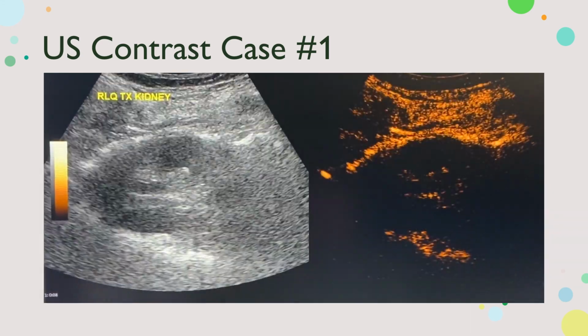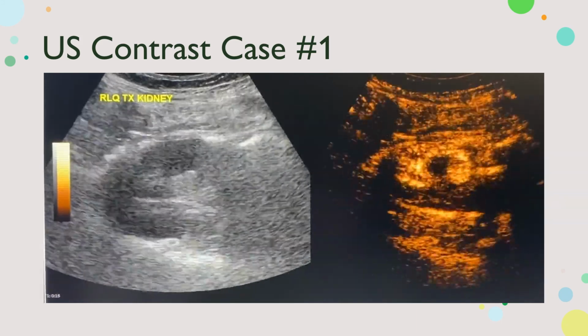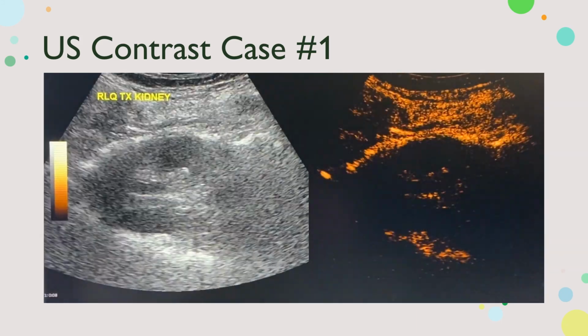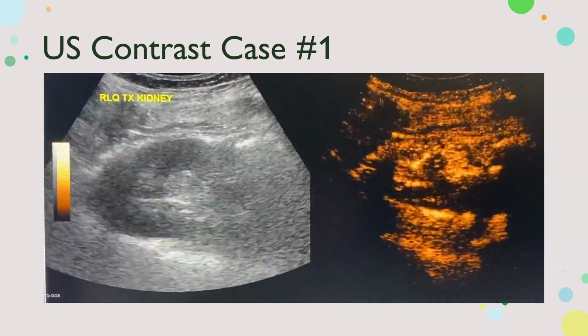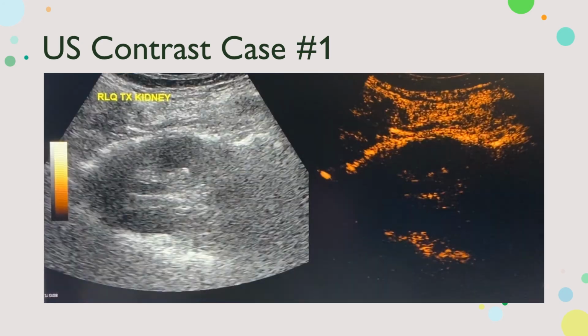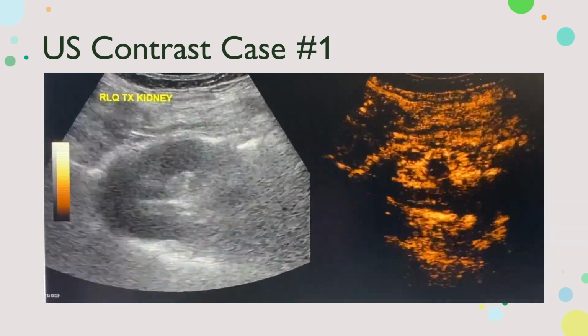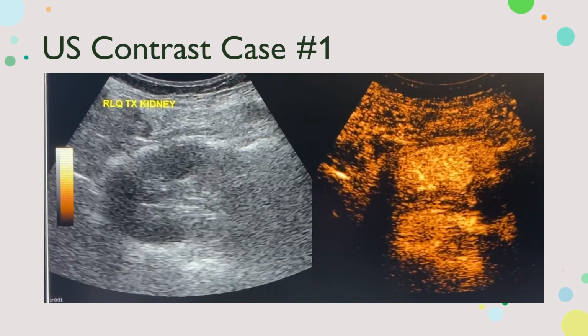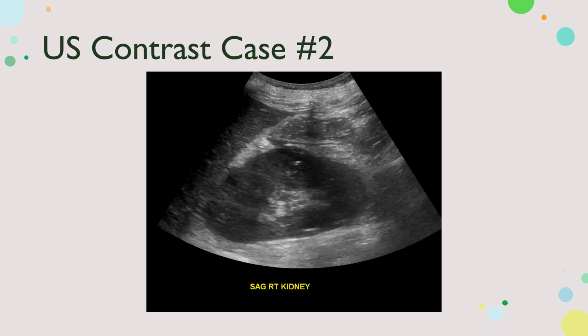As it turns out, this kidney, they had some complications during surgery and they wrapped the kidney allograft in a hemostatic material called Nu-Knit. It's like a sock they slid over the organ. That's why the regular ultrasound waves couldn't penetrate, but we were able to confirm that there was perfusion based on the study. This is another case that we had.